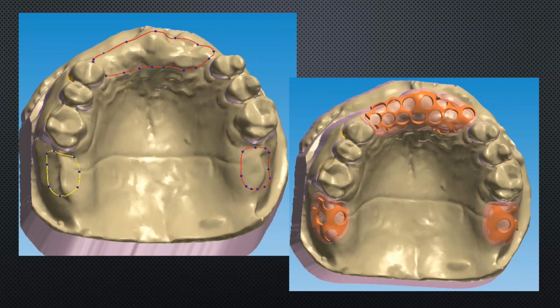Secondly, and probably the most important reason, is you're going to be packing or injecting acrylic to these. Now, if you're pouring acrylic, it's not as big of a deal. But when you're packing or injecting, there's literally thousands of pounds of pressure to push that acrylic in there. And you can definitely smush down a frame or move it. And then that acrylic is in a dough state, so that frame is going to stay pretty much where it's been placed at. And then you cure that acrylic. And because that meshwork was kind of warped a little bit, the major connector then may have a little bit of a warp to it. And you're just going to have a bad fit after you process that acrylic. So having those nice, robust tissue stops is important for your processing.